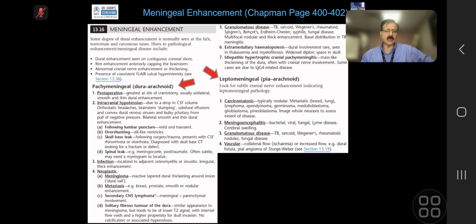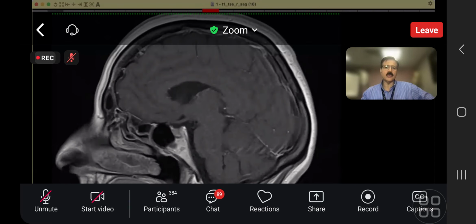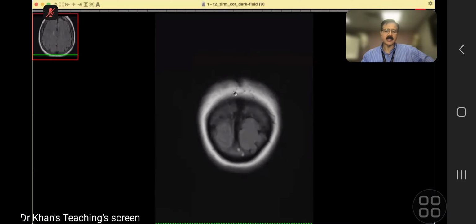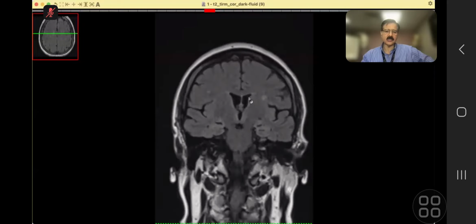So that is what you have to elaborate, which is on this differential diagnosis. It's a very, very important exam case, and your differential diagnosis should be up there. Now, in this particular case, I showed you a FLAIR sequence, and the beauty of this FLAIR was that only at the edge of the film you can see it. Otherwise, you cannot see it.